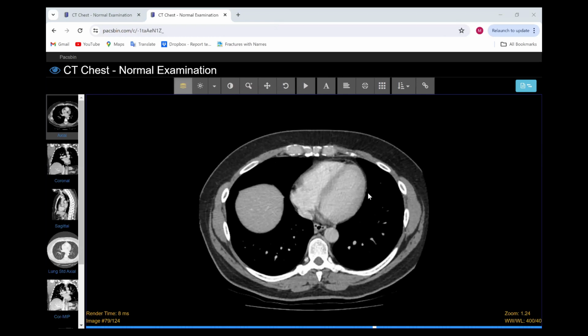Yes, the emergency and flail chest: when you find two-part fractures in one rib and in two or more contiguous ribs, this is called flail chest. The physician will call you and tell you the patient has flail chest already, but you should comment on it in the report.